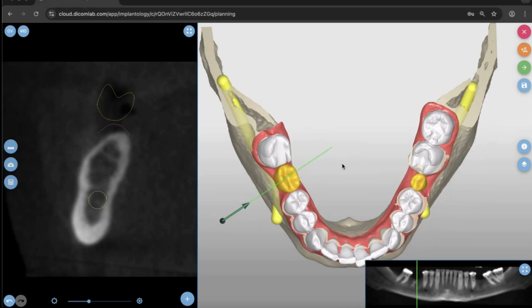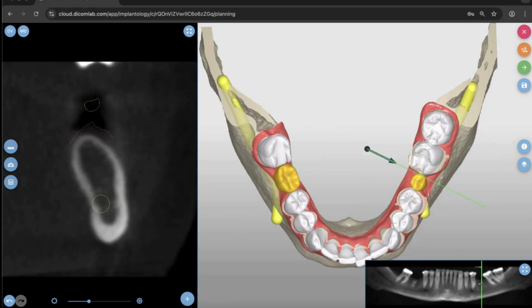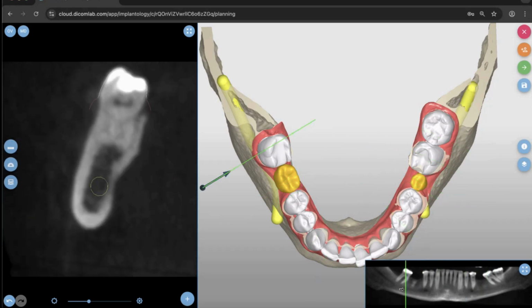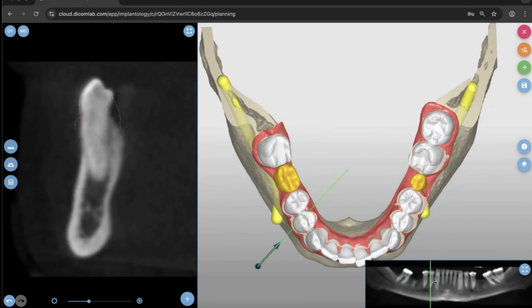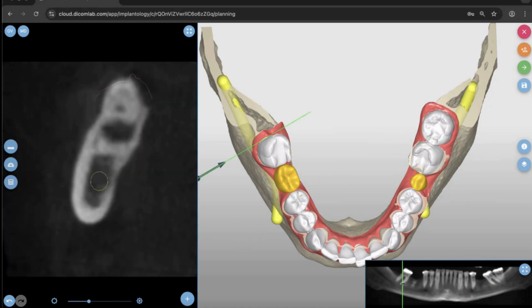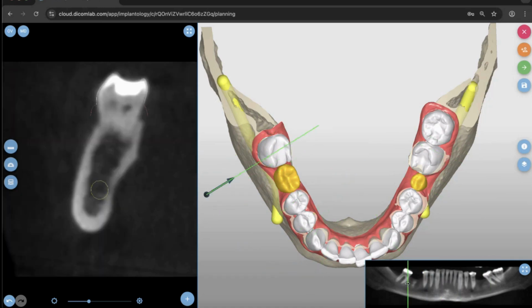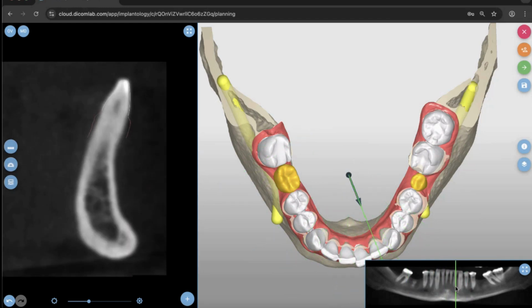So the logic of the software didn't change from the previous one. It's the same thing. I have to drag this line or this cross section at the panoramic window, and maybe you don't see it that well in this webinar, but you will see it in the recorded videos and also live on your patients. That wherever I drag it, it's super smooth. It's very, very simple, and you can really easily navigate through these cross sections.